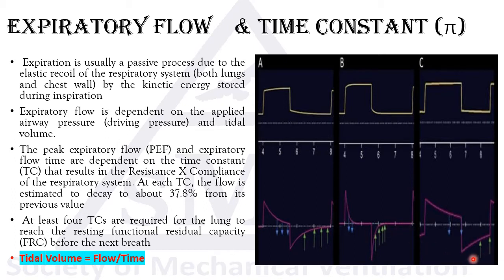Versus this patient, where you see a very slow expiration, so this here is almost only 2 time constants of the inspiratory phase and the expiratory phase, and we'll show that on the simulator in the next step. Next slide.